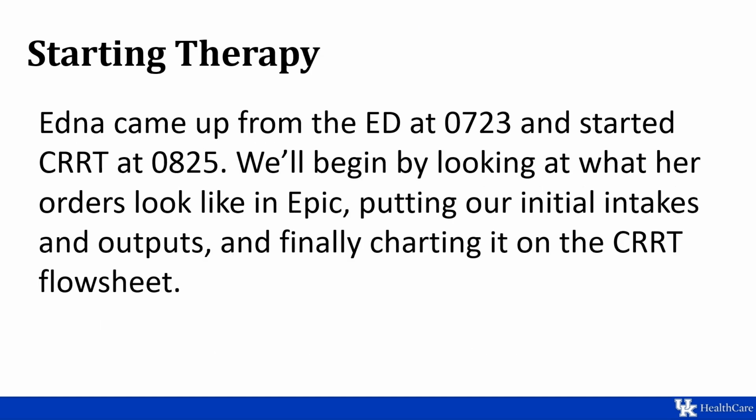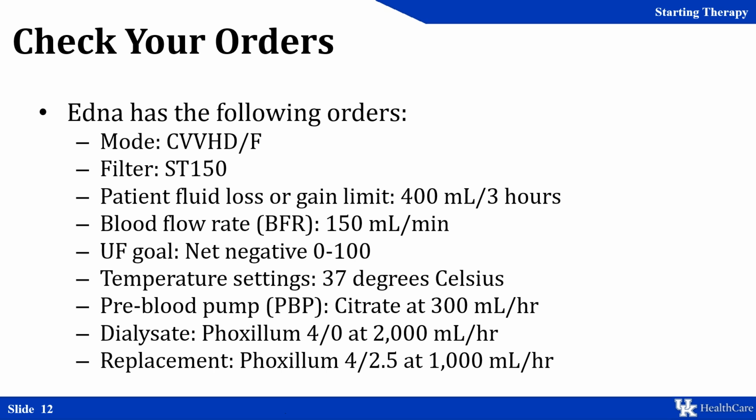So let's go through our fictitious patient, Edna. She came up from the ED at about 7:30, and we're starting CRRT on her at about 8:25. We're going to go through how we would actually chart all of this. Let's go ahead and look at our CRRT orders.